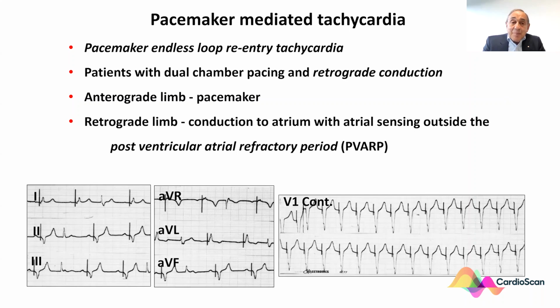Here is such an example of a pacemaker-mediated tachycardia or a pacemaker endless loop re-entry tachycardia. Here one can see atrial sensing and ventricular pacing. There are also spontaneous beats, which may well be ventricular ectopics. And then suddenly, while the ECG is being taken, in V1, we have the onset of a tachycardia, which continues on and on, an endless loop.